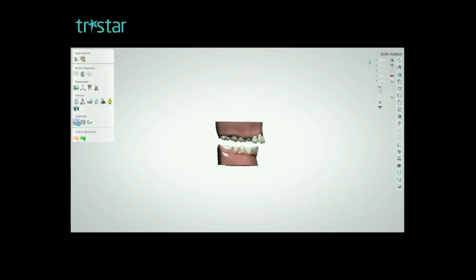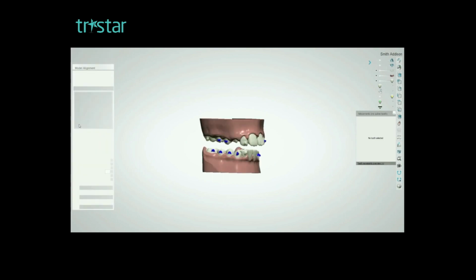A measurement should be taken with a ProJ-bite to ensure the limit of advancement is measured. There is no need to include the ProJ-bite within the design elements because we are using shortened digital twin blocks and the risk of interference at the terminal molar region upon occlusion is minimal.